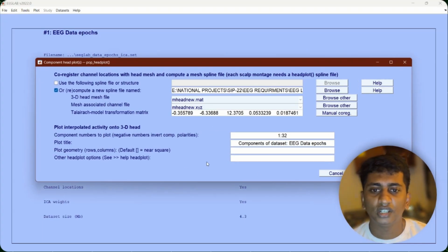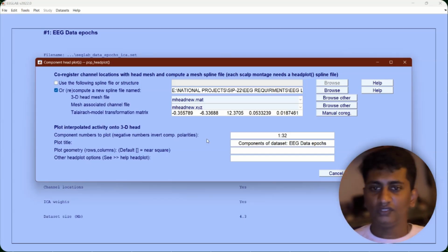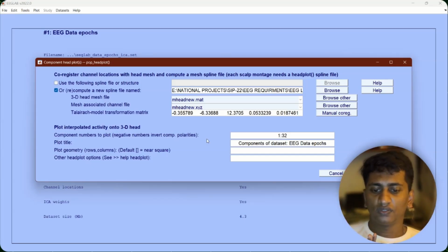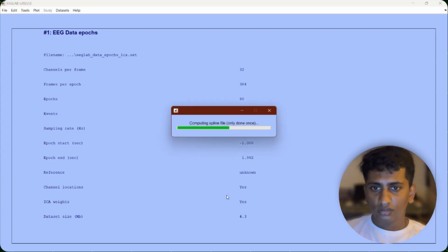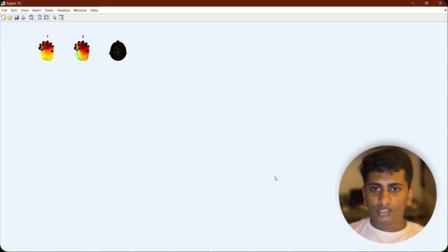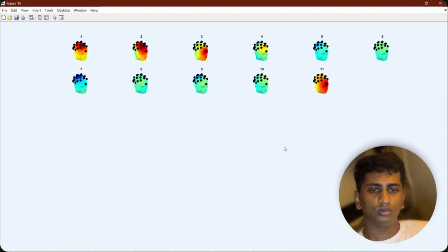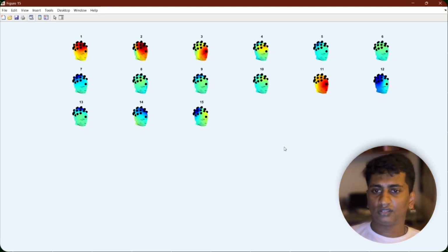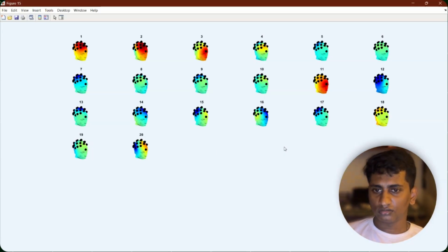Before processing the 3D data mesh, you need to upload the head mesh with all the details. Basically, if there's a head, you need to have the 3D model of the mesh so that you can upload all the data files in that. So we'll do this. You'll get an idea once it gets computed. So you can see the 3D modeling data sets, like how it is converting frequency domain data to image spectral based information. We'll let it load for some time.